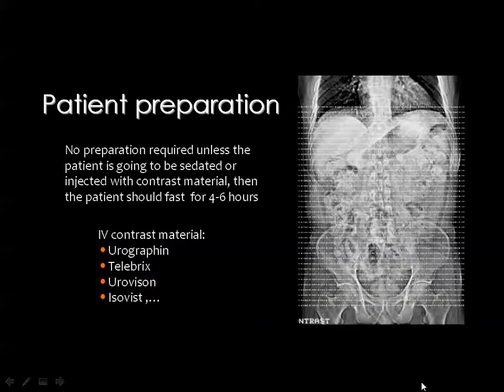And of course, in the chest and the abdomen, we should have a frontal scanogram in order to identify the plane of scanning. And we put two lines like this. The first one indicates the start of the exam, and the last one indicates the end of the exam. Then we would like to examine the abdomen from the level of the diaphragm until the level of the pubic symphysis, and this is known as CT scan of the body, or CT scan of the abdomen and pelvis.